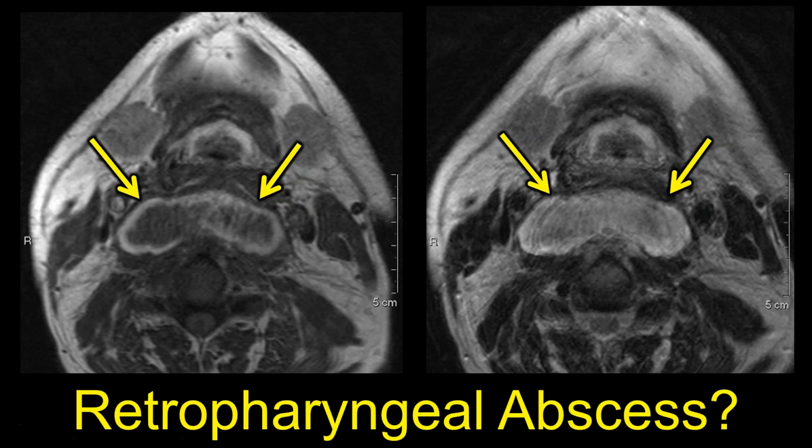Now we often see retropharyngeal abscesses if we have fluid collections here with surrounding enhancement, but we look at this image here, and it looks like it's bright on the T1 on the outside. Now you always need to be careful wherever you end up. Are the images fat saturated or not fat saturated, before or after contrast? That can get confusing. This looks like a fluid collection with surrounding enhancement. So you want to check very closely to be sure if this is a T1 weighted image before contrast or if it's a T1 weighted image after contrast.